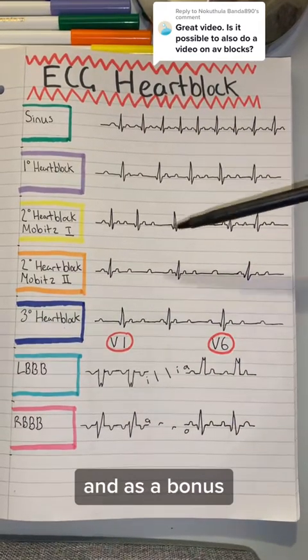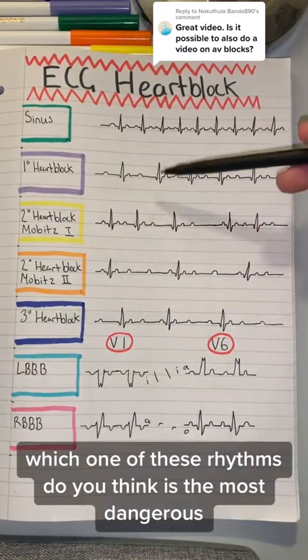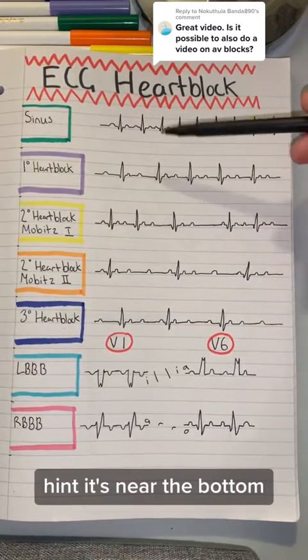And as a bonus, which one of these rhythms do you think is the most dangerous? Hint, it's near the bottom.